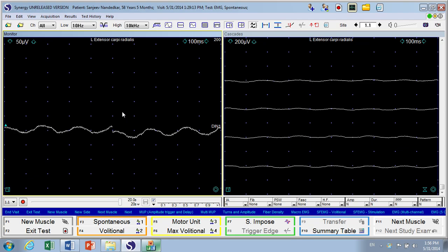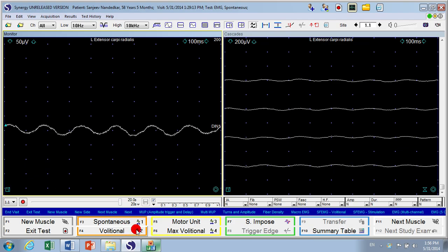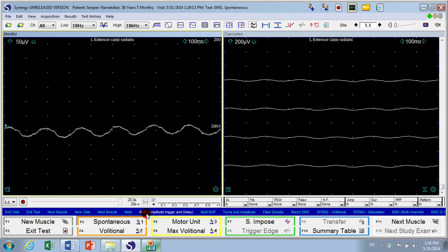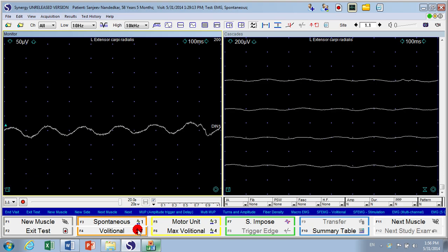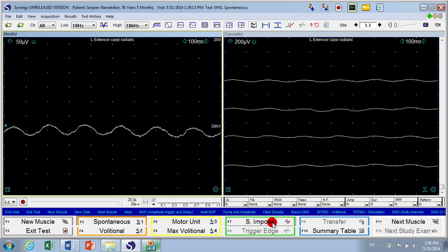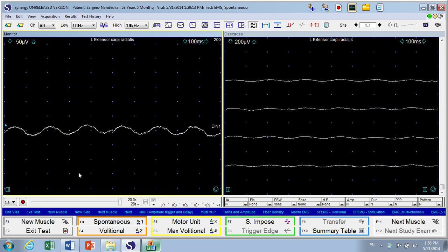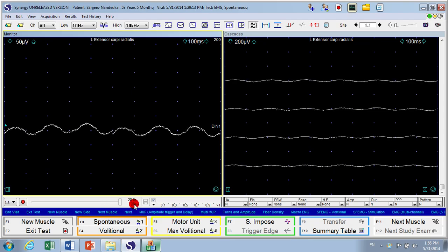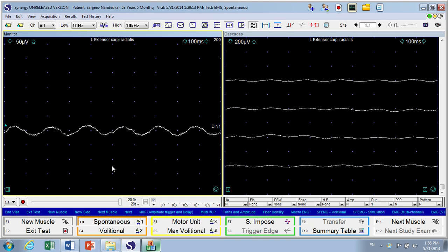So to summarize, the main change in the Needle EMG program is provision for 4 distinct stages of EMG assessment, the ability to have different settings for each stage, the ability to go from one stage to the next by using the FN2 button, docking the summary toolbars, the quality monitor, and the live play panel, the ability to save the live plays automatically, the ability to start acquisition automatically when you select a muscle, and the ability to review the signals by epochs that are saved in each stage.